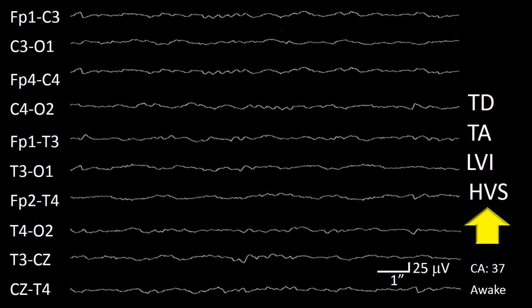That is during an exam. Then eliminate as many choices as possible based on the presence of continuity or discontinuity. Since in this epoch the EEG is continuous, tracé alternant and tracé discontinu can be eliminated as possible correct answers.